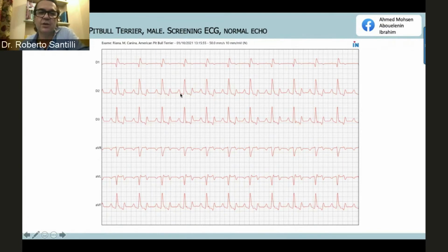As you can see here, if this is a P and this is a fragmentation, this is always the same. If it's not a P, it's an F with a 2-to-1 or 3-to-1 AV relationship, then it should be always the same. But in junctional tachycardia, this should change. So in isorhythmic dissociation, I want to see a variable PQ, or in case it's a synchronization type 1. But if it's a synchronization type 2, the P and the QRS complex are very close. It's very close, but then if you look carefully, they move.